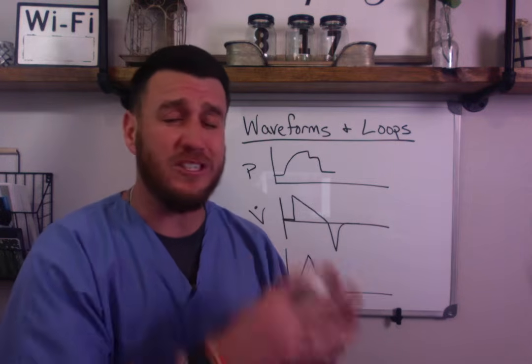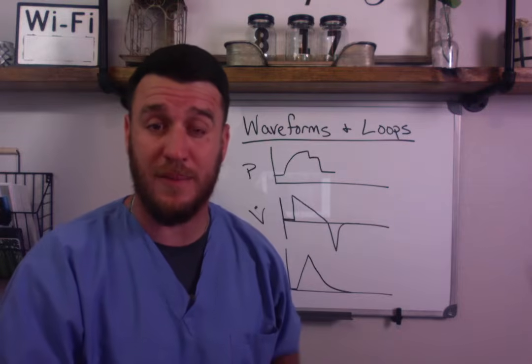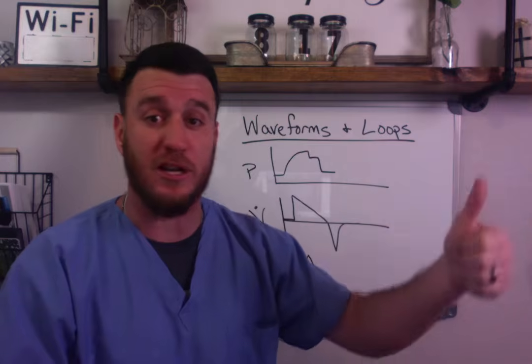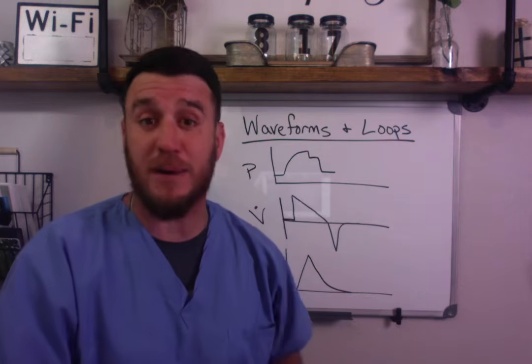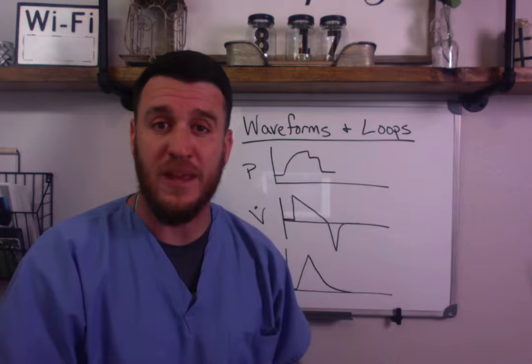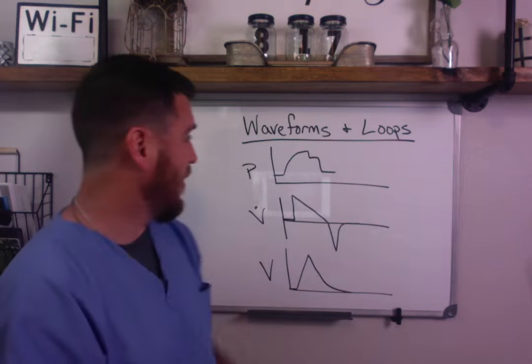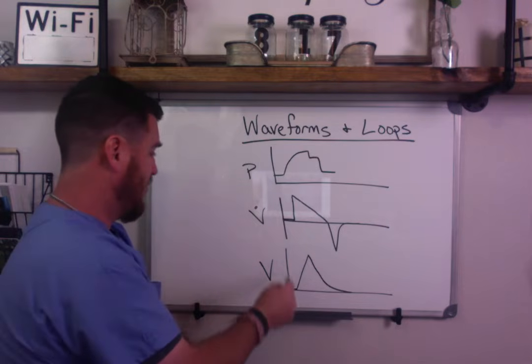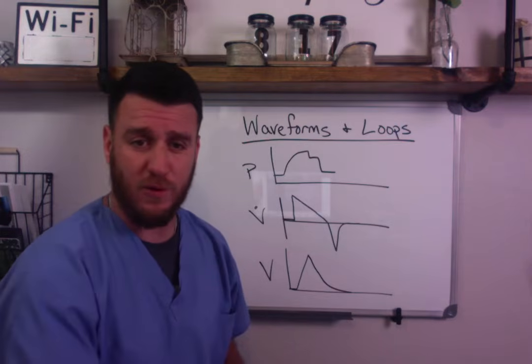Because you see, when you're just writing down numbers, and if you don't even have your waveforms pulled up on your screen, I know there's some vents out there where you can just put monitors up there and it'll just give you numbers. You're missing so much about your patient, and I hope this video illustrates what you're missing about your patient. Okay, so here we go. On the board here, I have our pressure waveform, our flow, and our volume waveform. Now, these are the three standard waveforms.